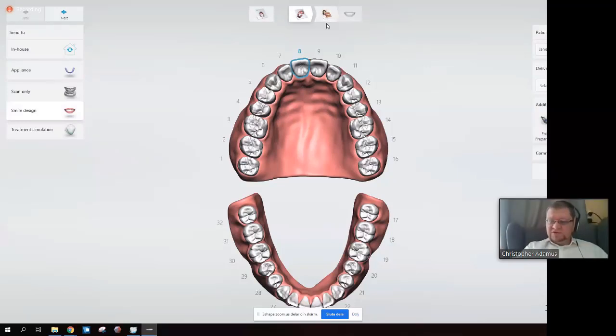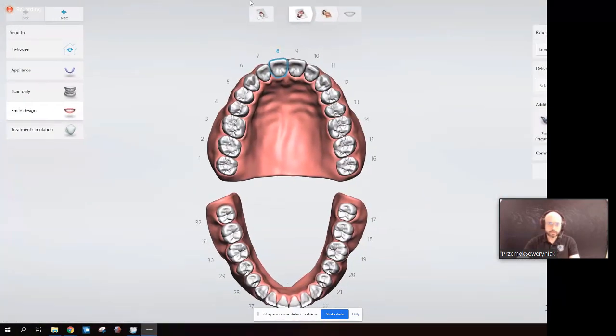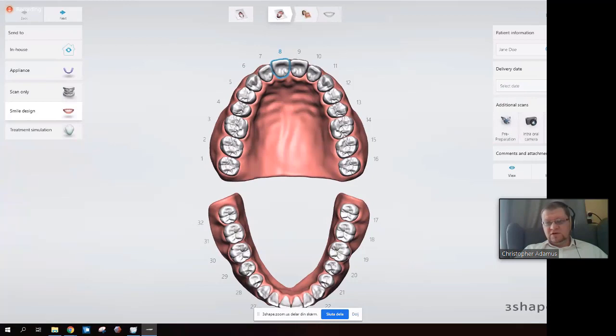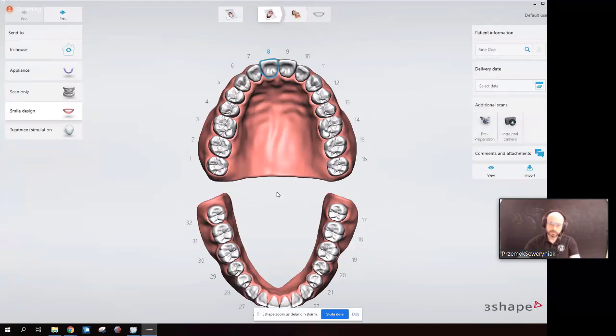I'm going to add just for a second, there is a black stripe covering the screen on the far right. So basically everything above 3Shape from the bottom right is kind of covered. So if you will be doing something on the very far right, if you could just explain what kind of functions you're choosing. Oh, okay. Hold on, maybe we can do it like this. Windows. Okay, can you see everything now? Yeah, it's like 90%, so it's great. Okay. A little more to the left. More to the left, like this? Now it's perfect. Okay, perfect.